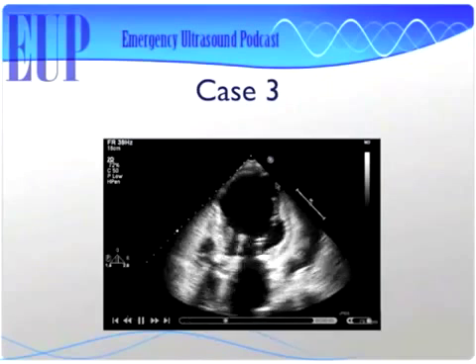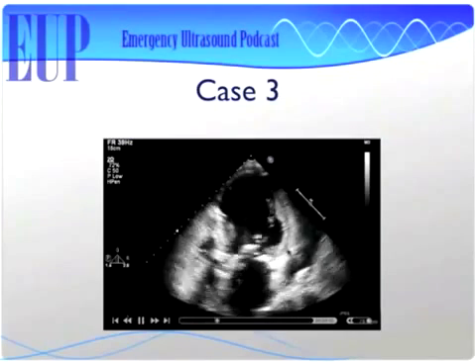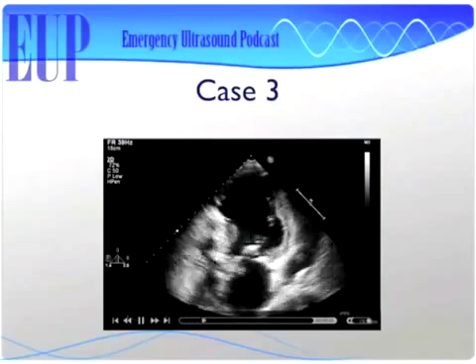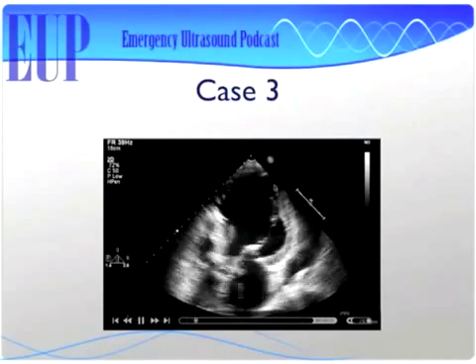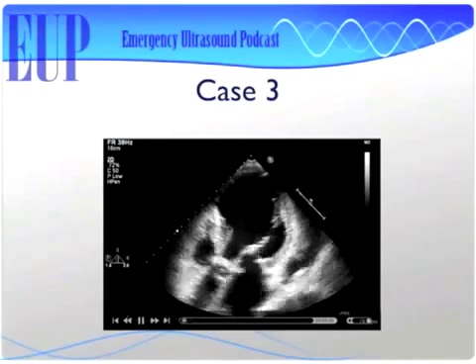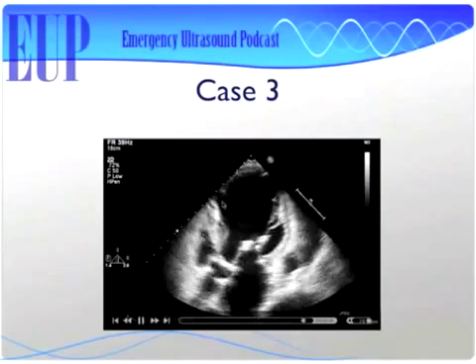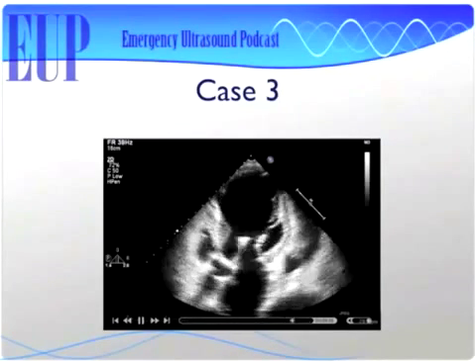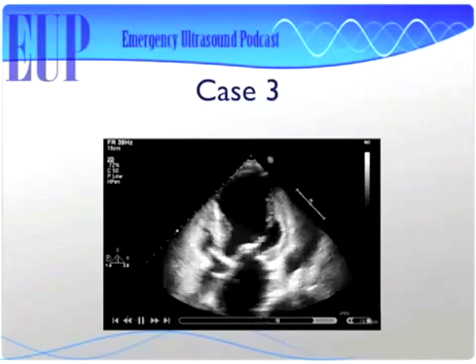And then over here, when we're talking about the inferior lateral wall, which coronary distribution is that? Our circumflex. Circumflex, awesome, perfect. So this is the circumflex area over here, and you can see that maybe there's a little bit of function right here towards the base, but up in here it's pretty crappy, if anything. So this person has some proximal LAD working, but everything else is pretty much out, and it's almost ballooning out here towards the apex. So this is a little bit of dyskinesis. We've got dyskinesis over here, and at least hypokinesis, maybe akinesis over there.